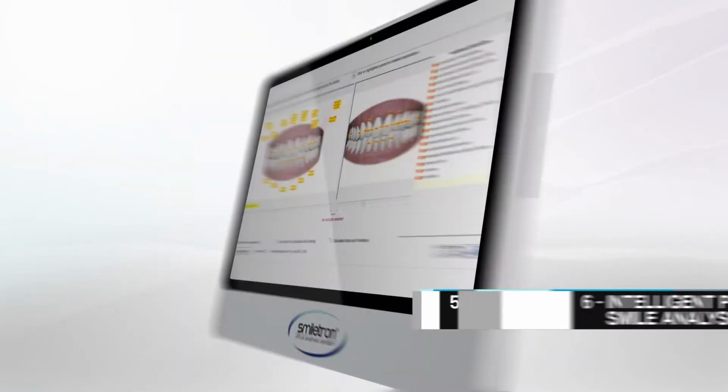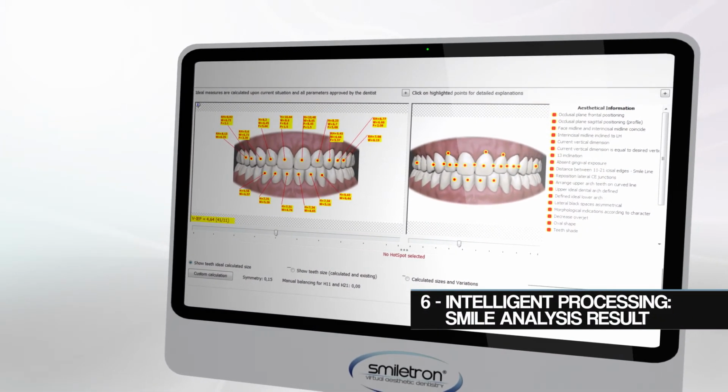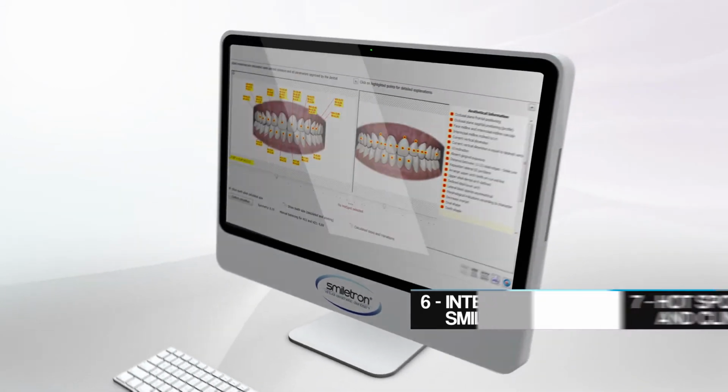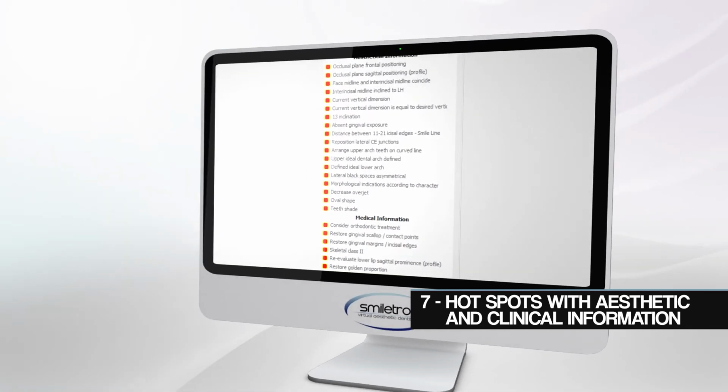The sixth step is the product of the smile analysis, the synthetic elaboration of the whole test displayed in a single screenshot, where all the synthetic data essential for smart, personal, scientific aesthetic rehabilitation can be easily visualized. The hotspots contain a synthesis of clear and simple aesthetic and clinical information for the specialist, the dental technician, and the entire team.